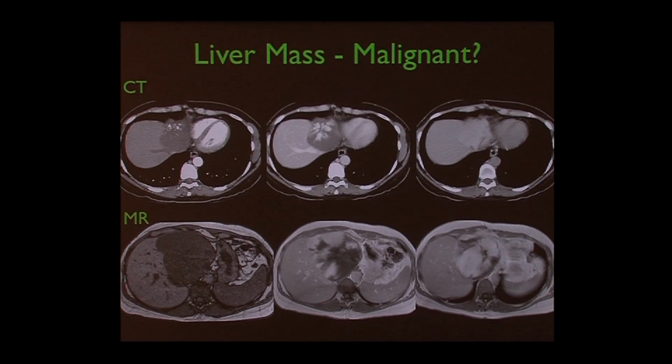This is a liver mass. This is a series of CT, and it's called dynamic CT. We inject the contrast in a vein, and we scan over time. So we might scan initially during what we call the arterial phase, when the aorta and the other vessels are really bright, and it causes some enhancement of the mass here, but most of the mass is dark.